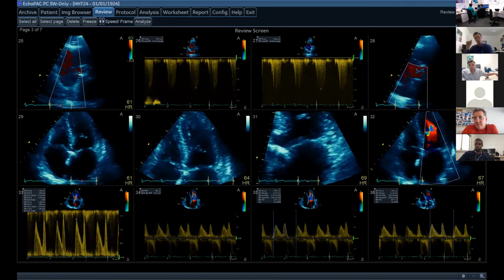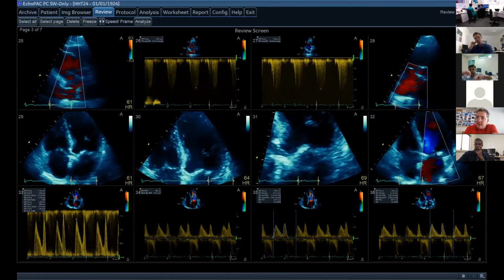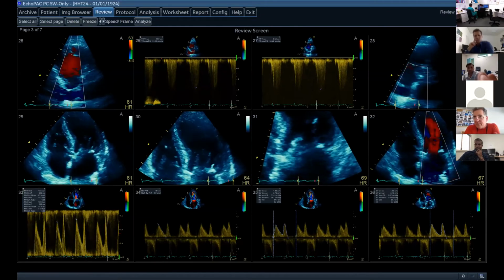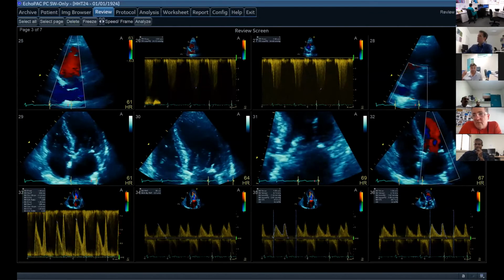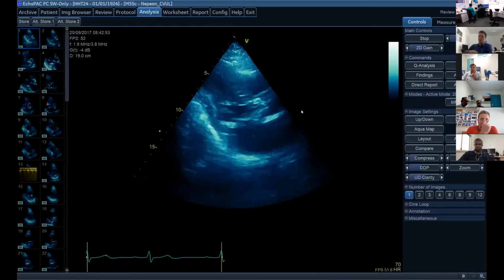We'd be pointing you towards the aortic valve. Yes, the way you would answer that would be very vague and general. This is parasternal long axis view, my findings are. But if you said, look, answer that from an aortic valve point of view. Yeah, I think it's probably, maybe I'll rephrase that then. So I guess this is exactly the kind of thing we'd be giving you.